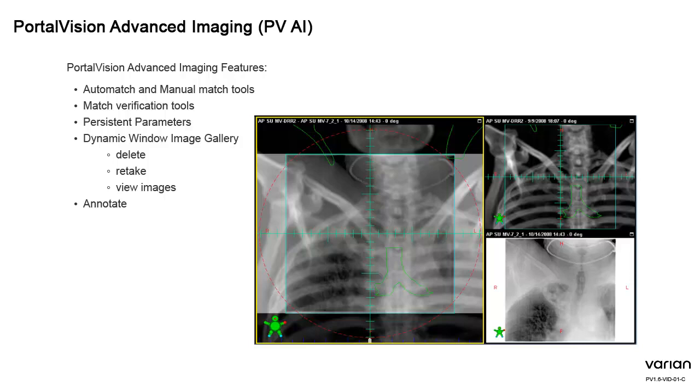Users still have the ability to save images and to see how far the couch needs to be shifted to optimally correct the patient's position.